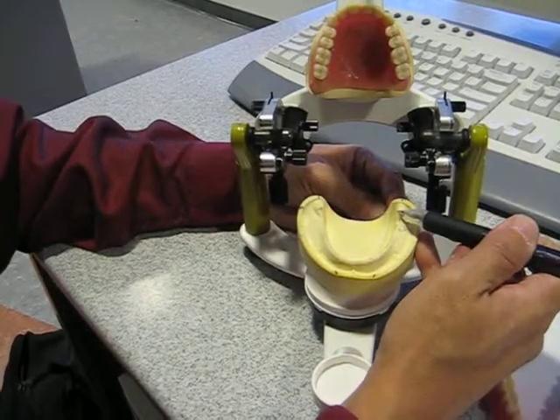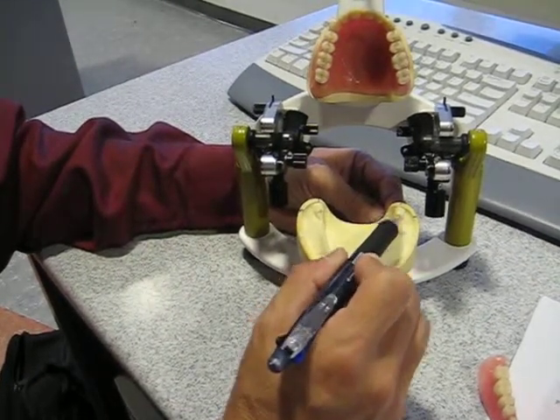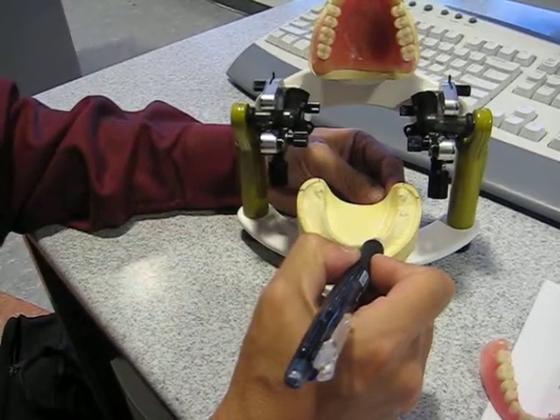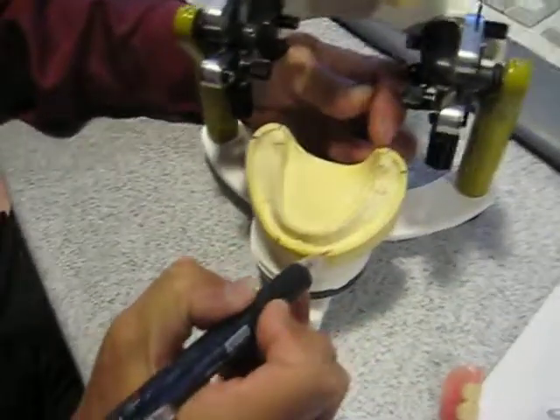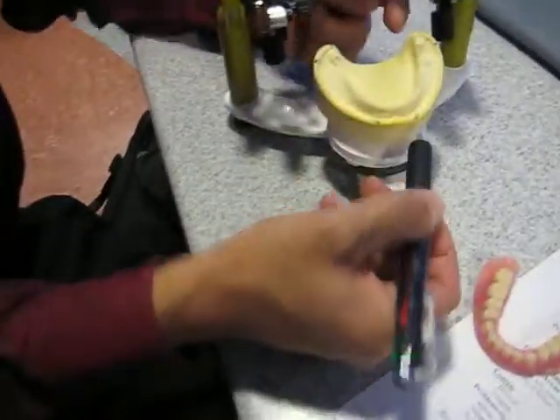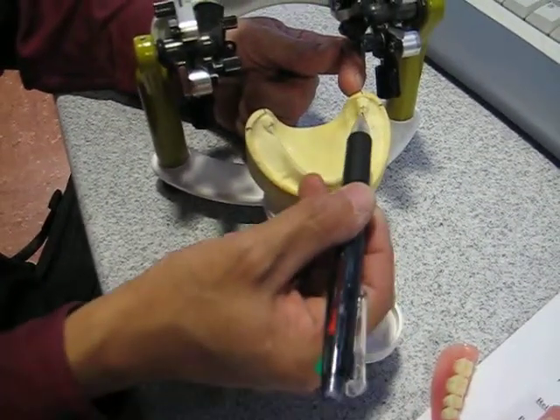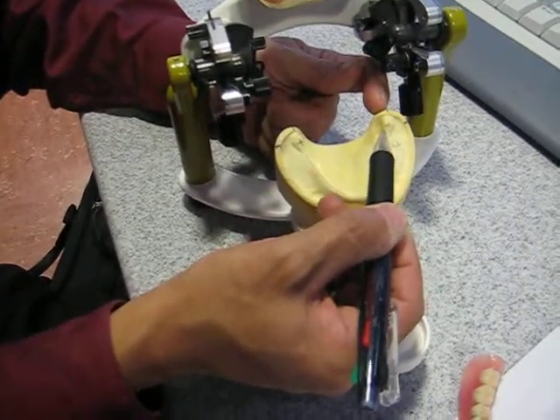We're basically connecting a point from the medial lateral center of the retromolar pad to a point approximately where the first premolar is going to end up being, and then we just connect those 2 lines in this view. What you're going to see is that on the patient's left side there's going to be a tendency to be slightly lingual to the ridge.